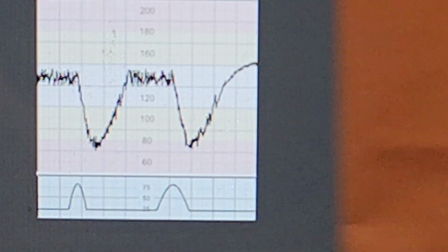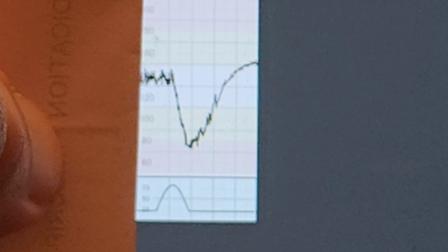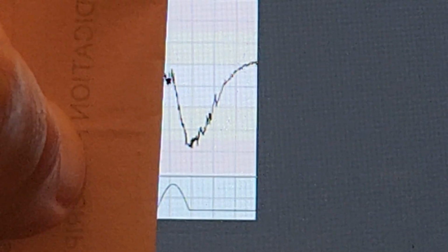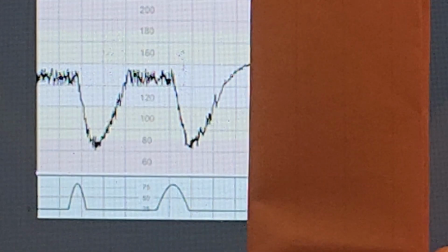So it is after, and again the contraction started here, and what happened is the baby maintained the heart rate for some time, and then started to decelerate, and here exactly the same, the contraction recovered, and then after some time the deceleration recovered.